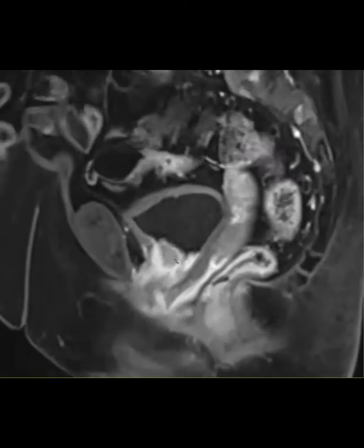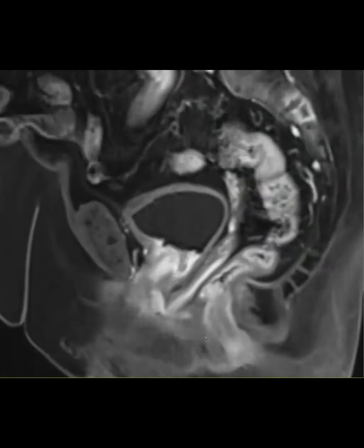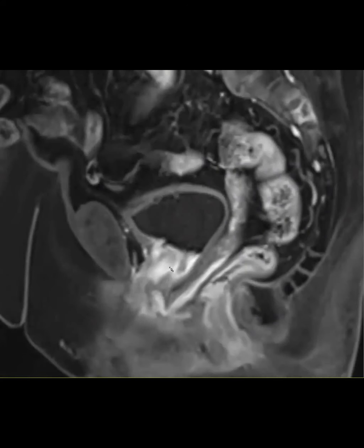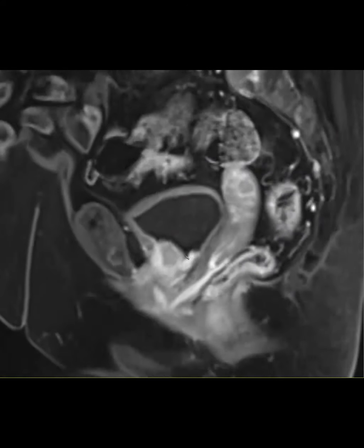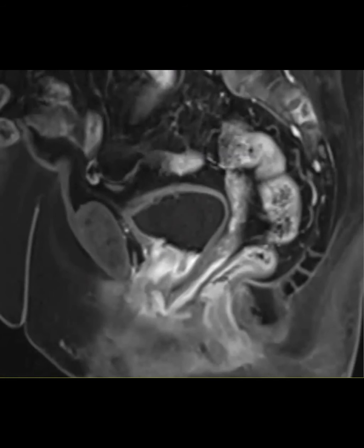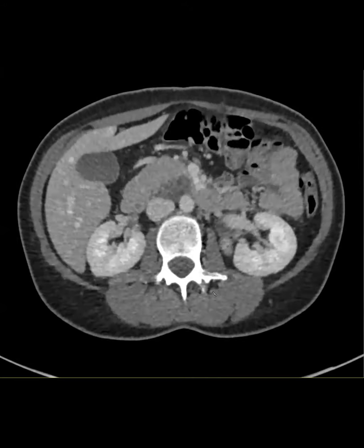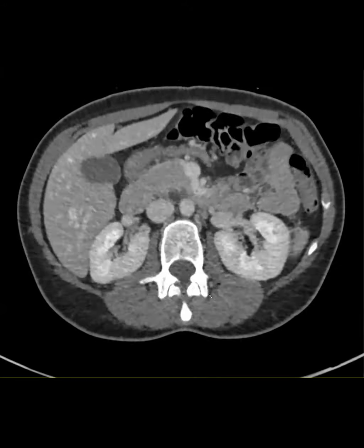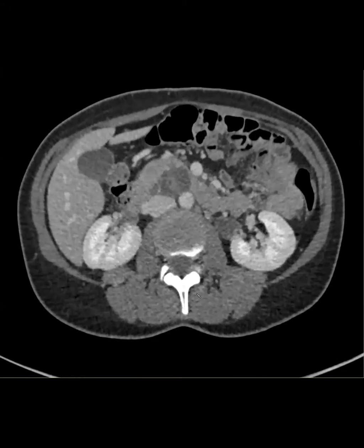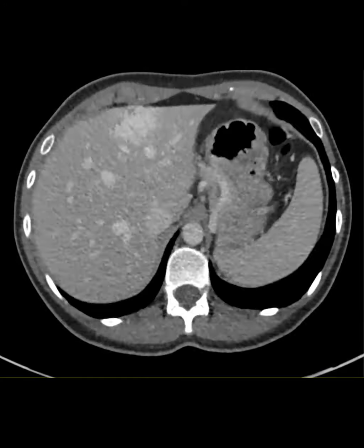But yeah, it was really aggressive. These bone mets had shown up within a couple of months, and now they have lung mets as well. So this was just a bladder melanoma, or urethral, probably urethral melanoma. Wow. I'd never seen that, and it was kind of scary, but it's going to be a path diagnosis regardless. This was a younger woman, like a 30-year-old female, who had some hemangiomas in the liver.